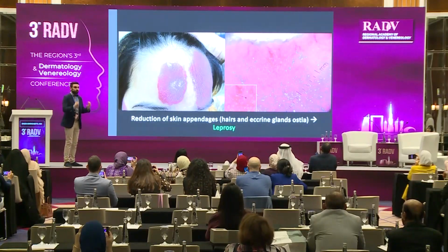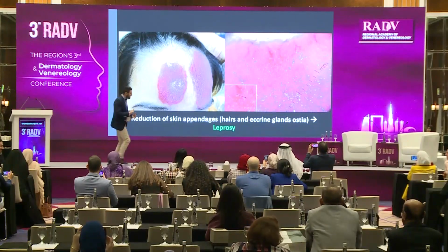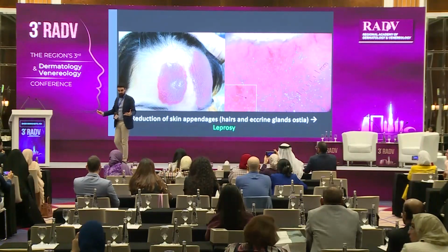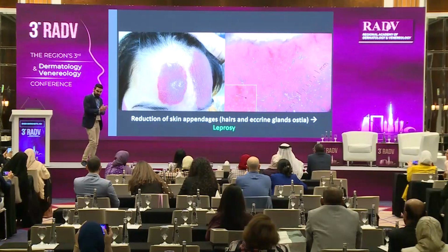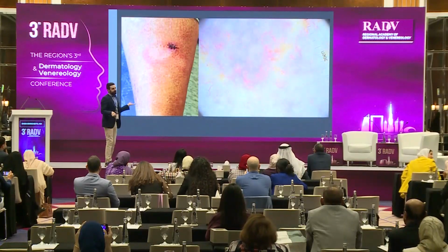In leprosy, the clue is the lack of skin appendages. So we see fewer follicular ostia and fewer eccrine gland ostia, because we have a destruction of skin appendages in leprosy. So orange plus a reduction of skin appendages. Great.